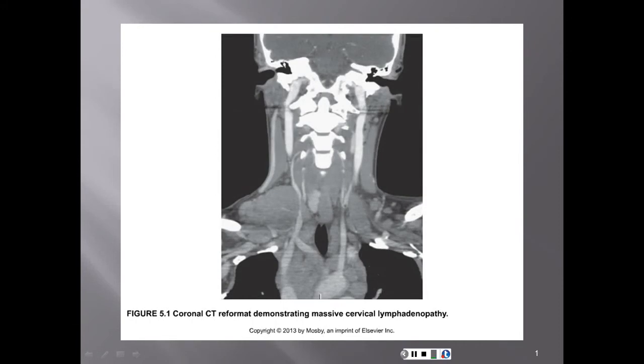In this module we will be looking at sectional anatomy of the neck. Head and neck is a term used collectively to describe the extracranial structures, including the sinonasal cavity, skull base, pharynx, oral cavity, larynx, neck, orbit, temporal bone. The head and neck region encompasses a tremendous spectrum of tissue in a compact space, with almost every organ system represented, including the digestive, respiratory, nervous, osseous, vascular systems.